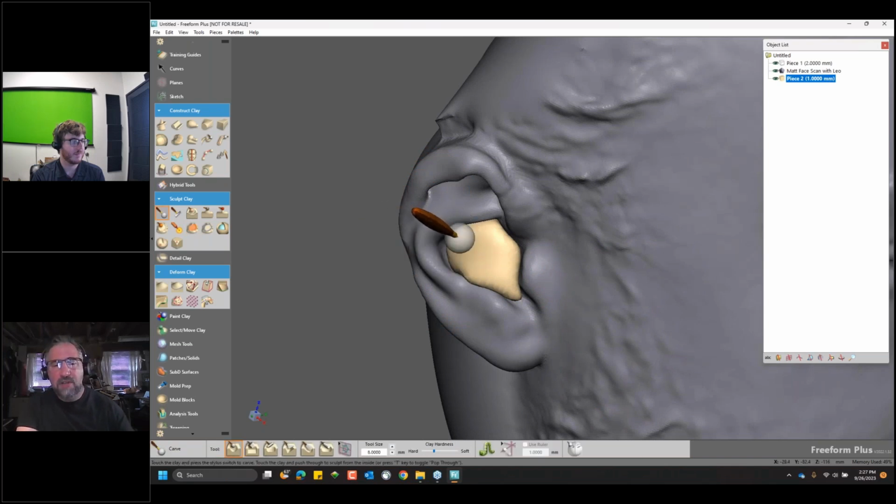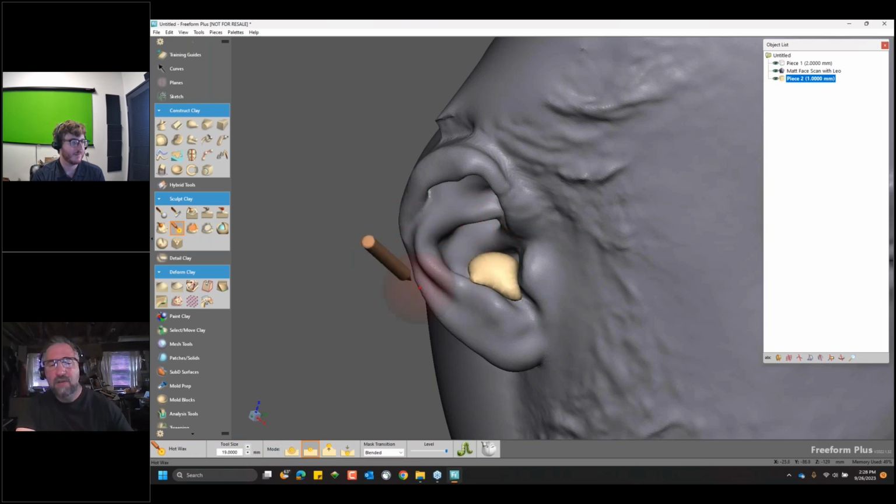So obviously, doing things like sculpting, which, as you saw from the video, this tool here does have an external device, a force feedback haptic touch device, which allows me to touch and feel. So for everything that I'm doing on screen, I'm actually getting a level of feedback that is completely unique to this design space. I can touch and poke and actually interact with this as if it were a physical object.